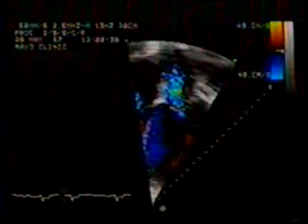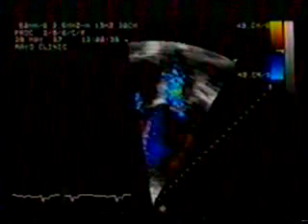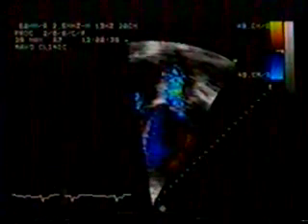For patients with mild or severe mitral regurgitation, the assessment of severity can usually be made by careful inspection of the color jet in multiple planes. For borderline cases, particularly those in which we are trying to separate mild from moderate or moderate from severe, a more precise method is necessary. One such method has been proposed by Drs. Helmke and Nanda from the University of Alabama, Birmingham.